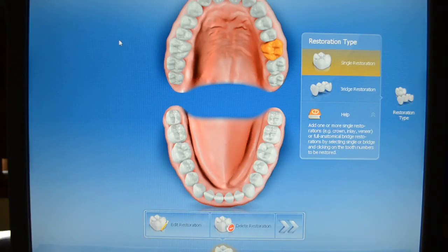Second reason we may want to use biogeneric copy is if we are working on a tooth that is an abutment for removable partial denture. We can replicate guide planes, rest preparations, contours for reciprocation and retentive arms.